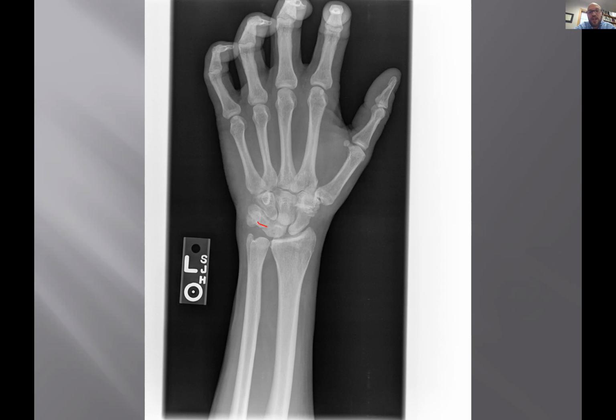It doesn't just stay in this row, and then you've got another row of carpal bones. It kind of overlaps. In fact, we used to learn this in class years ago, called the pi sign. The pi sign. When the lunate is not in normal alignment.